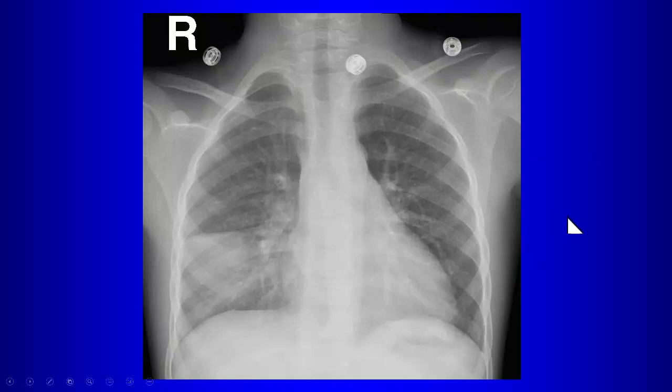What segment? Why do you say lateral segment? You don't see the heart borders obscured. Yeah, the heart border is pretty clear there.